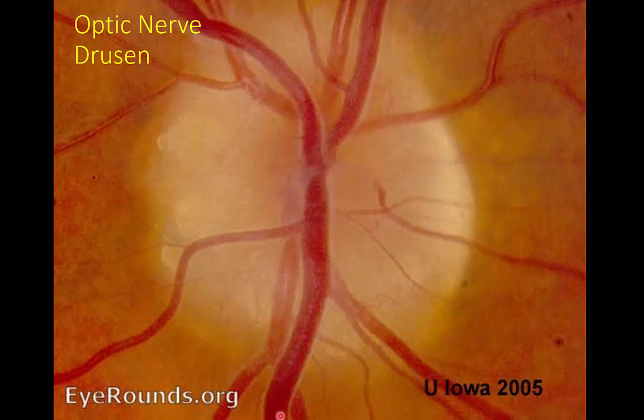Now the disc here is really blown up, and you might say, well, gee, it's not so sharp over here. It's not so sharp over here. It's obviously a lot better over here on the temporal, so you might be tempted to say, well, this is probably early papilledema. But when you look closely, you see this kind of glob, this lumpy appearance. This is optic nerve drusen. This is a benign finding. It does not represent papilledema.